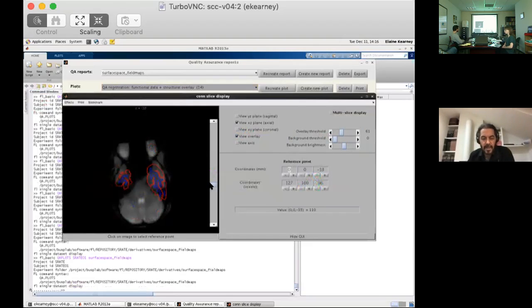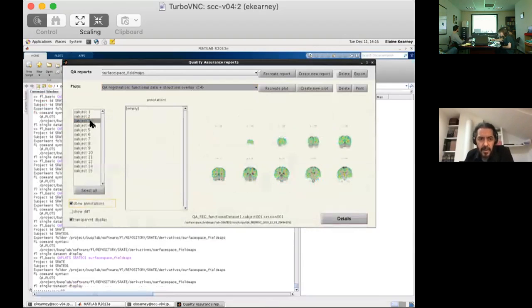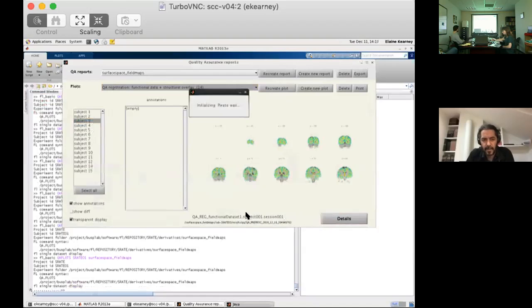But I think that for these two, we need to look more into how to deal with just having the phase encoded warp field. For the other ones, could you show subject 3, or some other subject that is not 1 or 2, just to take a look at how those roughly look? Because I know subject 1 is perhaps something else, since we didn't have the entire.